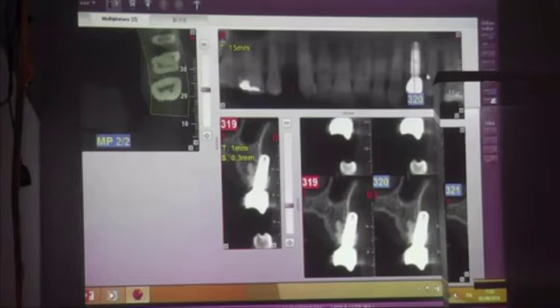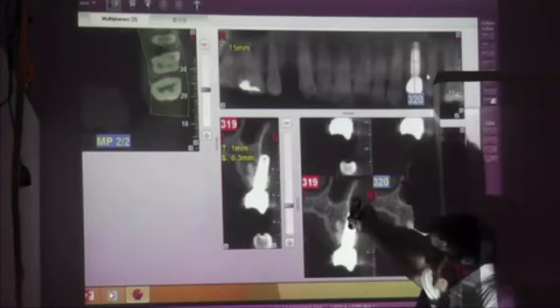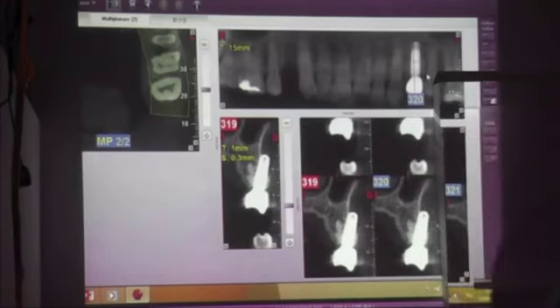And if you maintain the inclination of the teeth in the maxilla, this is the result. The implant goes out. 99% you lose the implant. In this case, the doctor is a very lucky doctor. But he made the implant in this area where you remove the root.